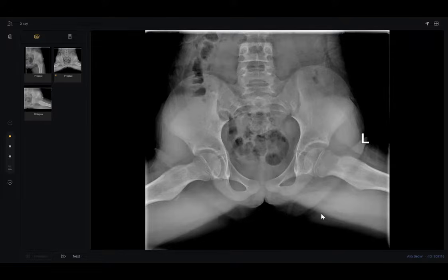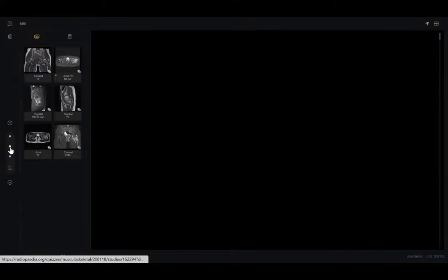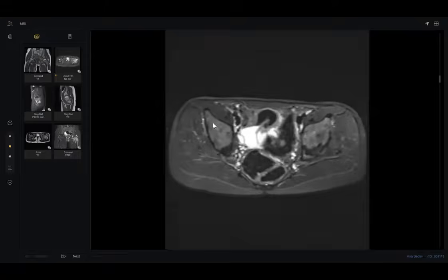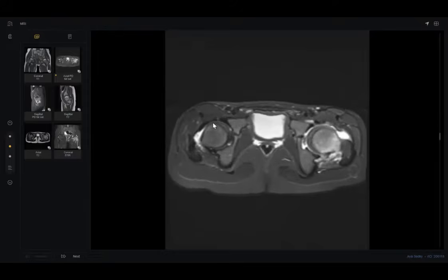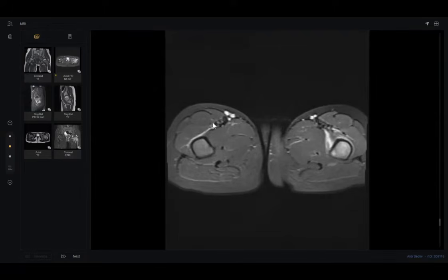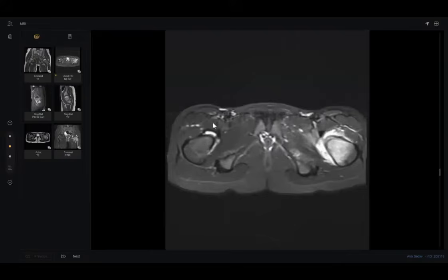We can also perform MRI to rule this out, but there is a long wait for the MRI, so that's why I asked for CT first. No. In the pediatric age group, MRI is better to protect them from the radiation.